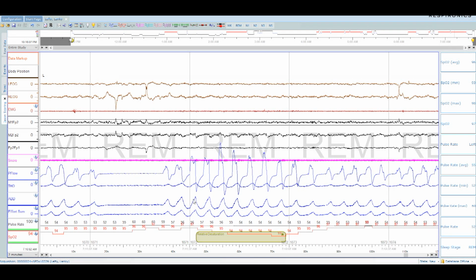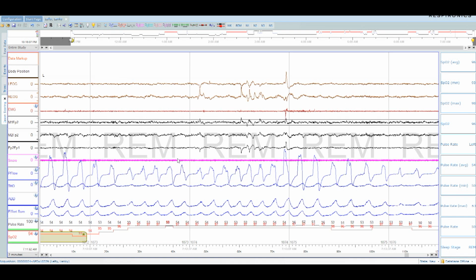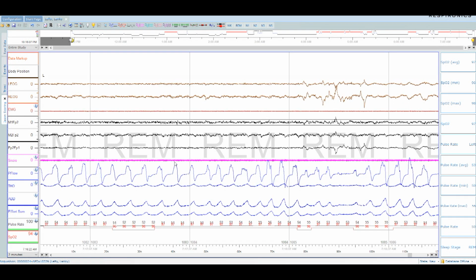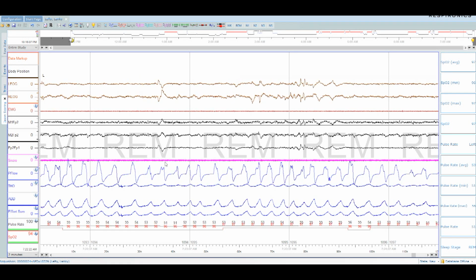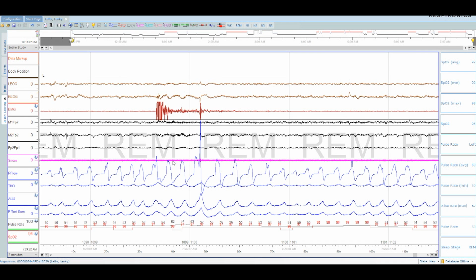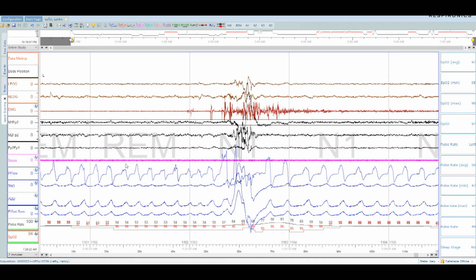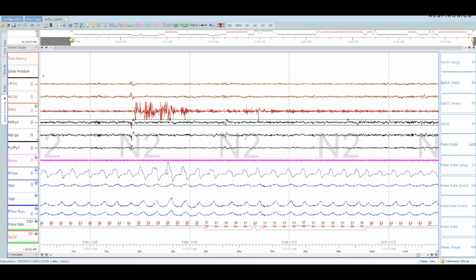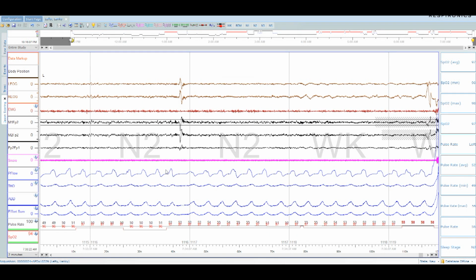See that? Look at this. I have to call this a central apnea because it's so long. But I don't want to. I'm letting you know that. I think it's ridiculous. No arousal. Yeah, there's desaturation. Ho-hum. So I'll tag it because I know that's what the ISR, the ever watchful eye, would want to see. But I don't like it because it's REM sleep. You see those transient central apneas in REM. They don't mean anything. What you really care about are back-to-back-to-back central apneas. Those are a problem. The little one-offs, not a problem. Wouldn't worry about it at all.